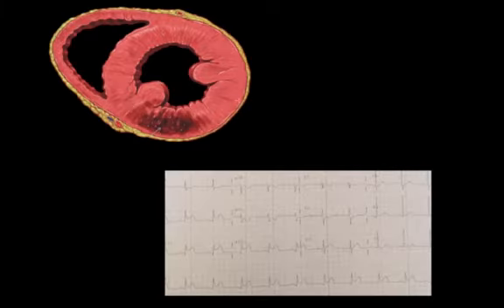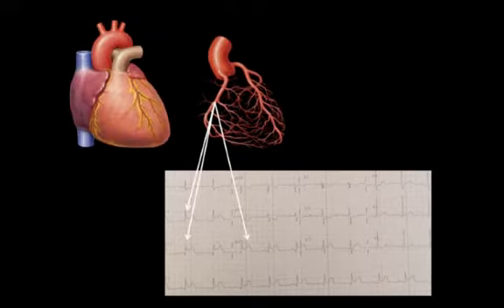No matter what the level of medical training you have, chances are that you have been taught the use of electrocardiography to identify ischemia when assessing a patient with chest pain in whom an acute myocardial infarction is suspected. Not only emergency physicians, but doctors in general, and even medical students are expected to learn how to recognize ischemic events on EKG. The rationale is to identify which region or wall of the heart is being affected based on the leads that are compromised. But getting a three-dimensional picture is often tough and certainly requires practice with EKG.